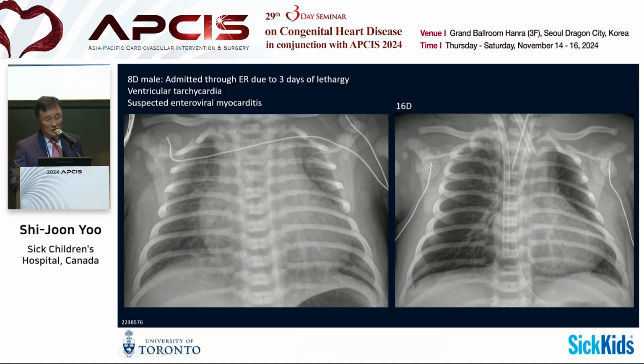Here is another case: an 8-day-old male admitted through the ER due to 3 days of lethargy and ventricular tachycardia, suspected enteroviral myocarditis. Here, at 8 days, there is cardiomegaly, but at 16 days you have exactly the same finding. It's a different patient, but very similar.